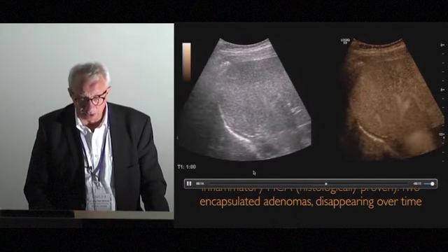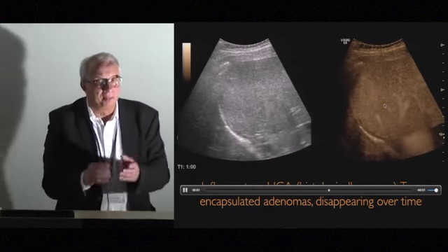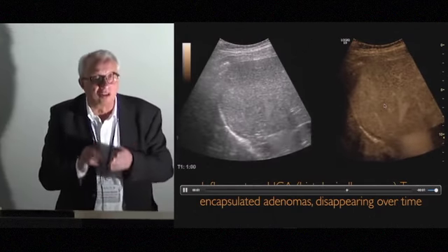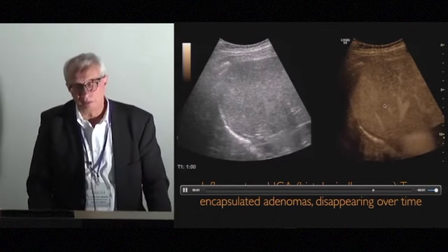And this is later. Of course, after 1 minute, it's gone. There's no capsule anymore. Because the capsule is not non-viable tissue, it's also viable tissue, so it takes up contrast over time, but not in the arterial phase.